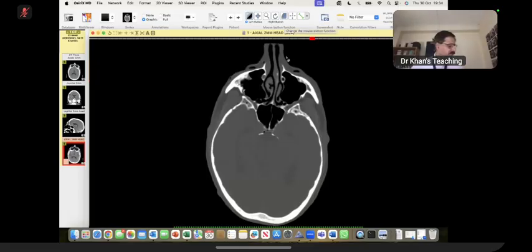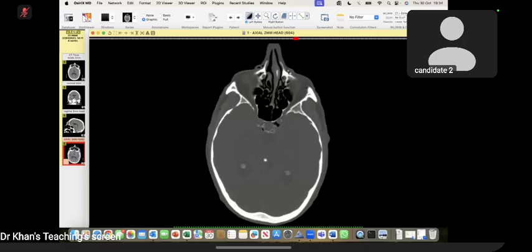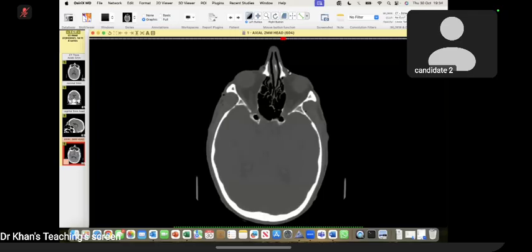Where you said left what? Left. I'll scroll through that point. Sir, I could appreciate a few air density areas within the left optic canal over here.